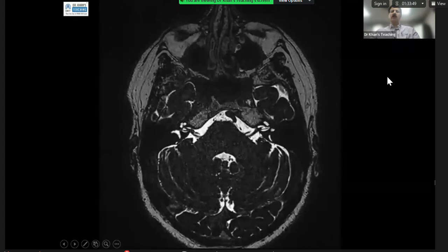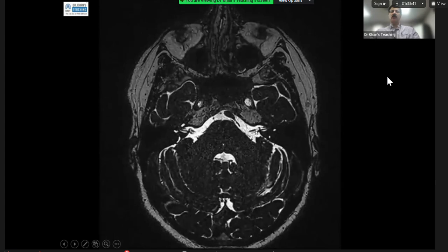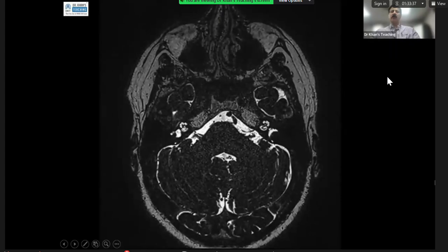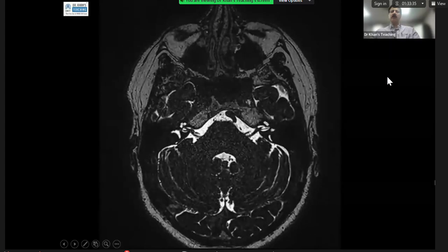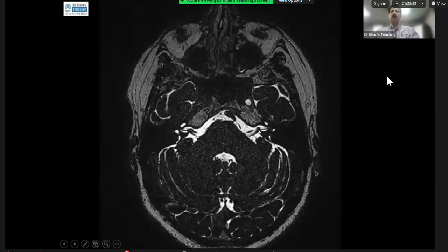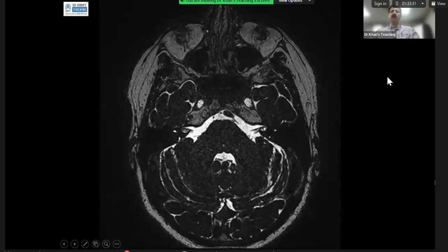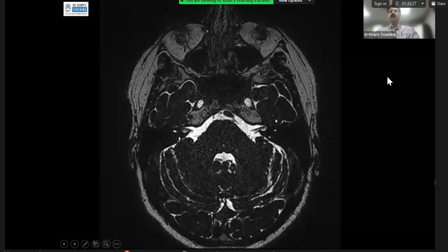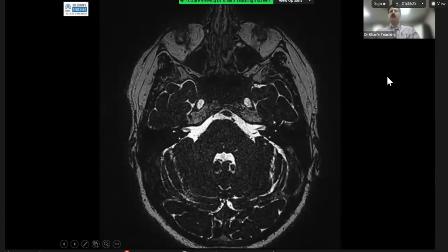Let's go to our friend, the facial nerve. You can see there is a thinner nerve than this one here. And this goes. You can see that the cochlea is going superior, so the cochlea is no more visible, which makes sense. And then you lose it. On a CT scan it is still visible, but on an MR you don't see it. This is a CISS sequence.